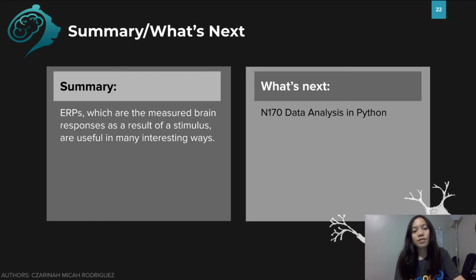So just a side note, a lot of the code used here in this notebook is provided by NeuroTech-X. NeuroTech-X provides other sample codes for analyzing other ERP experiments and not just the N170 experiment. So feel free to look up other NeuroTech-X notebooks to find other free and useful resources, including tutorials to learn more about EEG data analysis.